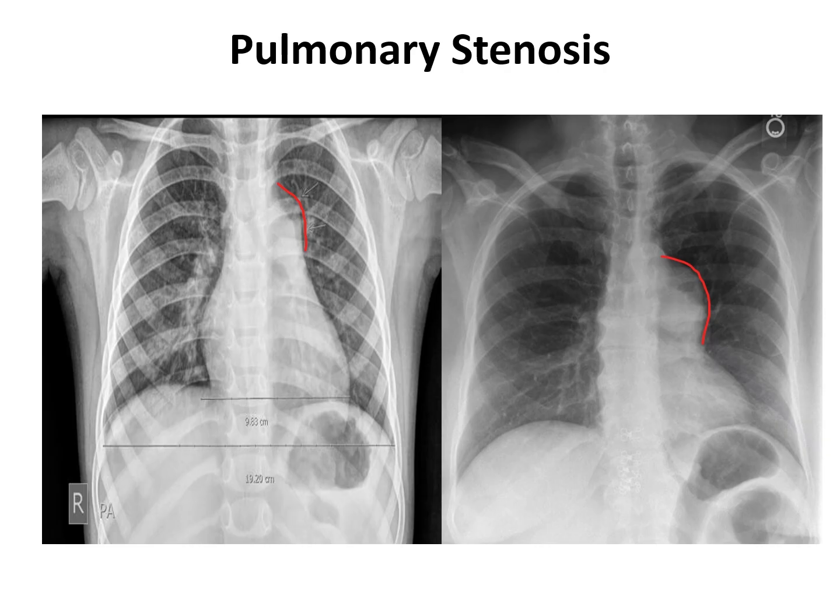And there is also potentially decreased peripheral pulmonary vascularity. So we can see the enlarged size of the pulmonary artery, whereas the other peripheral vessels are within the normal limit, as well as the heart, which is also within the normal limit.